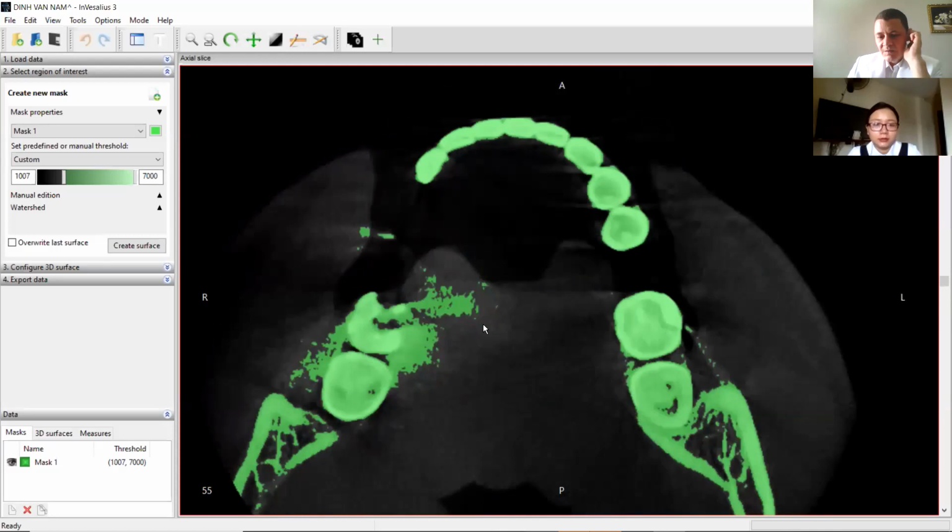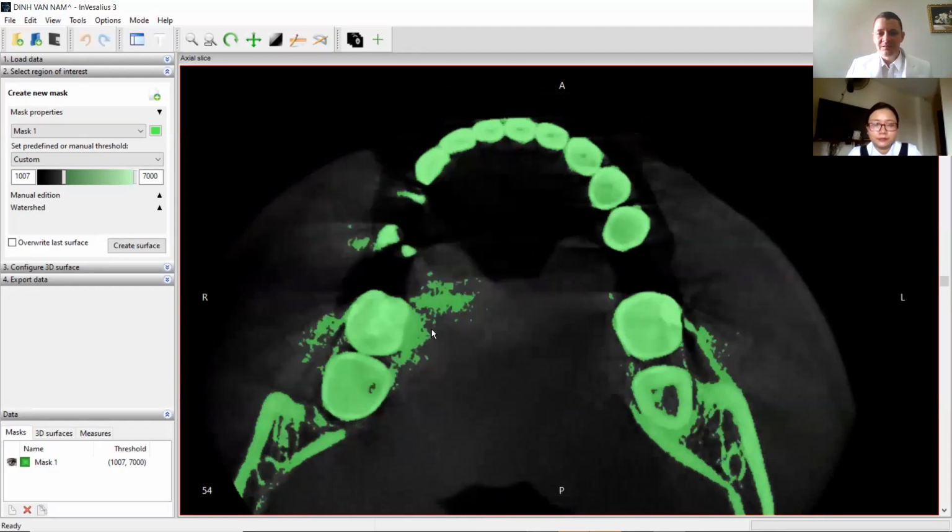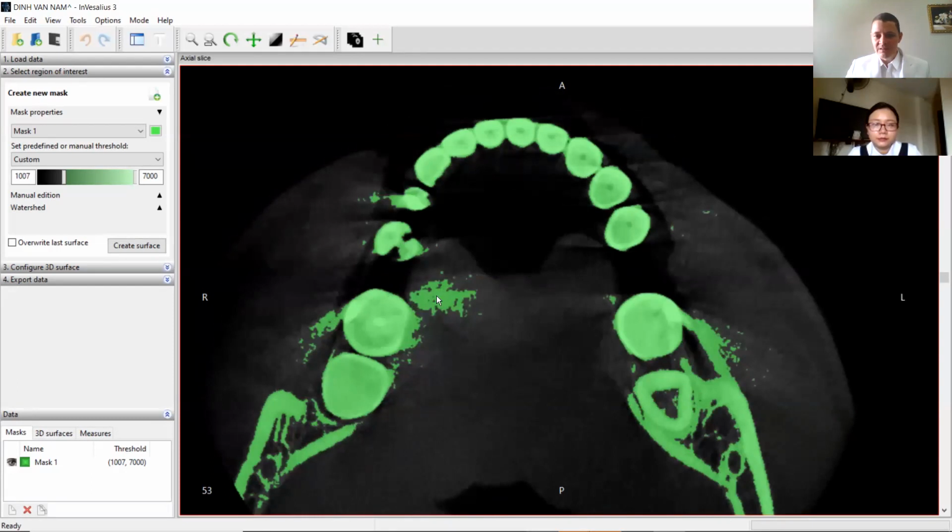Yes. And here you see something interesting that you will not really see if you use professional software, because professional software cleans automatically. But you see that there is nothing in the mouth outside of the teeth here. But when you look at the CBCT, it tells you, oh, the voxel here, there is a very dense object.